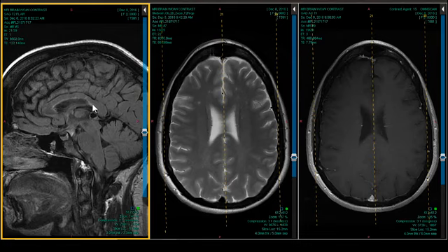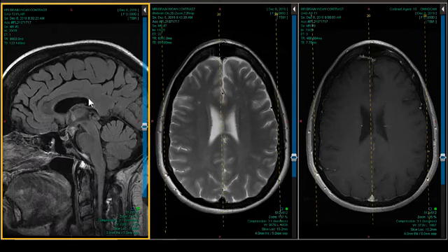And these are right angle oriented, even though this isn't MS. I mean, these are very typical perpendicular looking lesions. So I think thinking of MS as your first consideration is totally reasonable in a case like this. Also a beautiful shot of the massa intermedia and the hypothalamus right here while we're at it. So this is Susac syndrome. It's a triad, and so you get hearing loss, visual loss, and something that looks like MS.